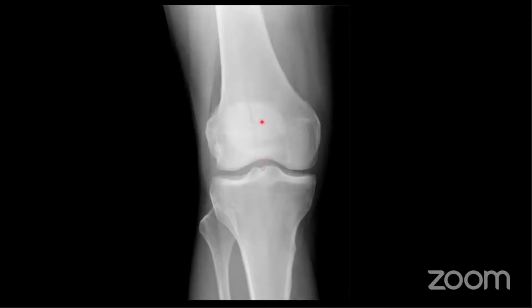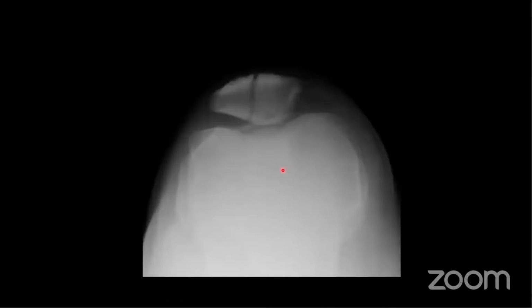Yep, good. So this is a patella fracture. See this lucent line here. I was hoping to trick you. I've spent all this time talking about looking at the cortical outlines, and I was hoping no one would look at the patella, but yep, you guys have all seen it. And this is also why we do the skyline view, because it's much more obvious on this view here.